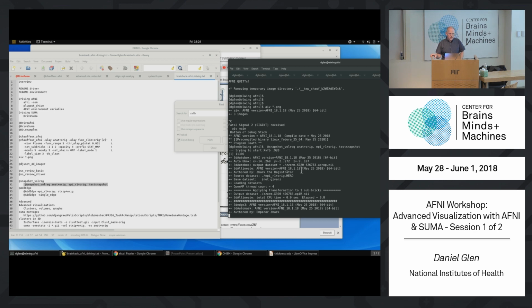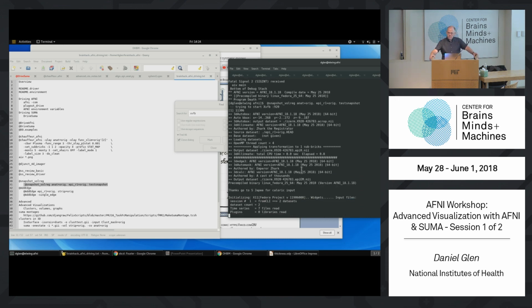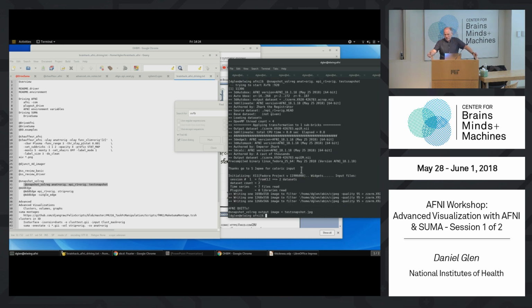Maybe we could dump a text file like this and have it help us drive examples like this or something. Yeah, so this would need to be in full data sets. Or you can call it on the command line with the data set where the paths are. It will save it locally though. Okay, so it saves our data set as our test snapshot.